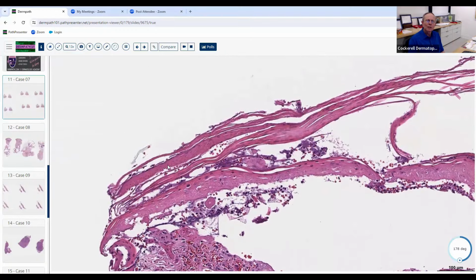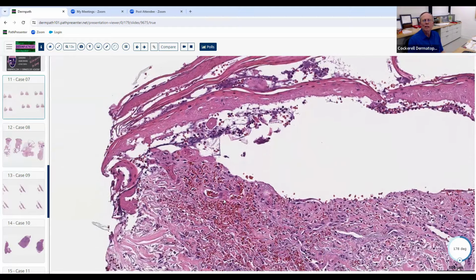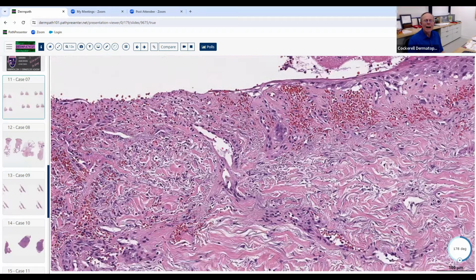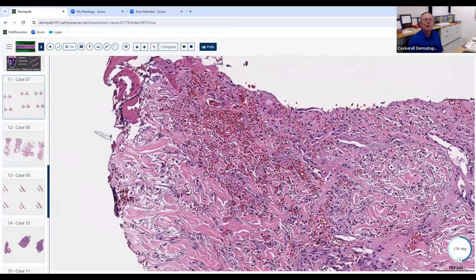If we were to see this, where you've got a dead epidermis that looks like an eschar, and then a second eschar, highly unlikely to be outside in. That suggests it's more likely inside out. Usually if somebody kills their skin, unless they're doing it at a very, very frequent basis, it has a chance to reepithelialize before they do it again. These are both dead at the same time. So it's highly unlikely that this is an outside-in job when you see that. So let's see if we can get any other clues to why this epidermis is dying. And there's all this extravasation of erythrocytes here.